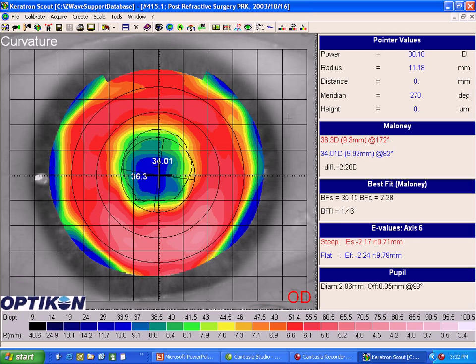In post-refractive surgery cases, peripheral asymmetry becomes just as important as anything else. As you can see on this post-surgical cornea now, the inferior section is quite a bit steeper than the superior, and so you could anticipate that a lens would have a tendency to be pulled down. Now, there will be a reverse geometry type of lens on this eye, but nevertheless there still will be a tendency for the lens to be pulled down to the lower half of the cornea rather than riding up high.